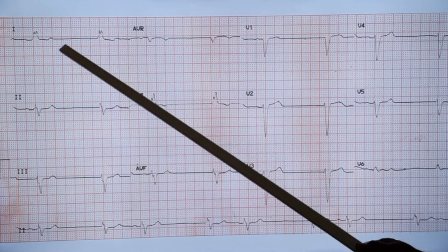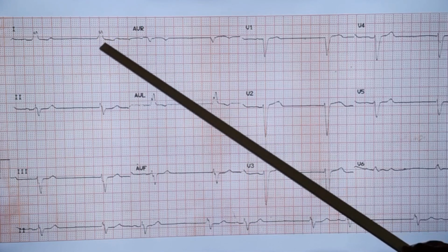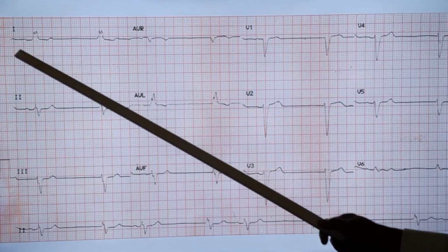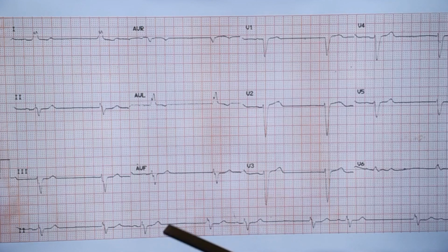You look at the basic ECG. You can see that there is an M-shaped pattern in lead 1, AVL, and V6, which would suggest a left bundle branch block pattern. So one possibility you can think of is this person had a pre-existing left bundle branch block pattern, a conduction system abnormality below the AV node. So it could be a pan-conduction system disease because sinus bradycardia is there.